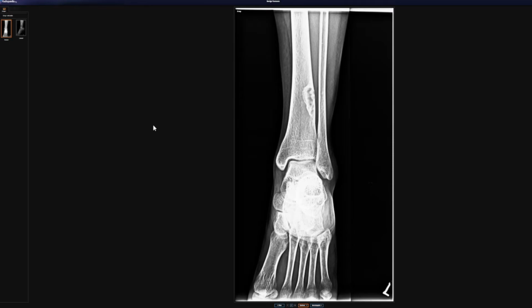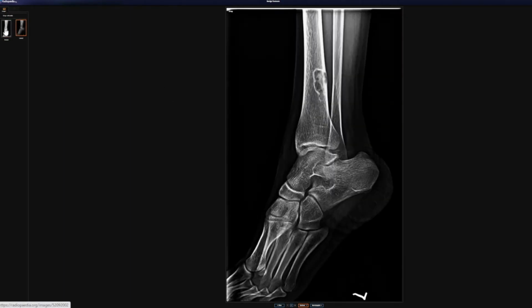So moving on from that very confusing case of the giant cell tumor, this is your much more typical appearance of a benign primary tumor process, where on this patient's left tibia, we can see the left hand marker is present down here, and we've got AP and lateral projections for us to work with.